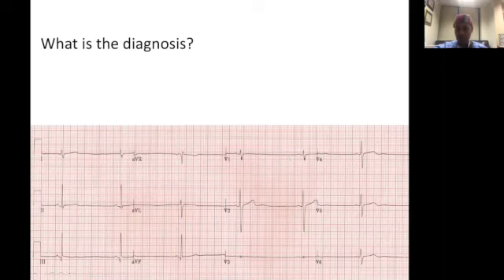Your diagnosis is correct. There is a P wave present, but the RR interval is prolonged, more than 8 large boxes. Good, good. So the RR interval is prolonged. Good. So between this R and R, you have a ton of boxes.